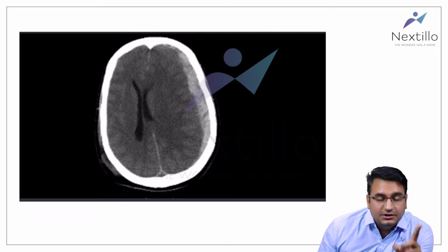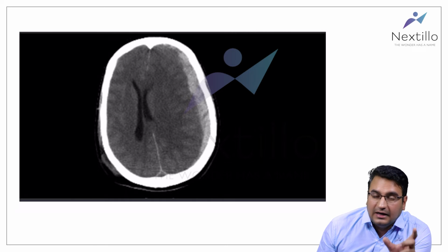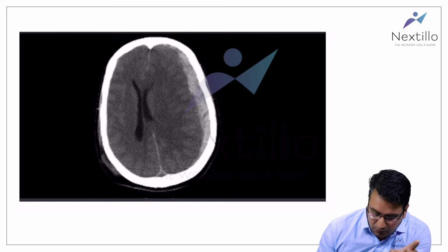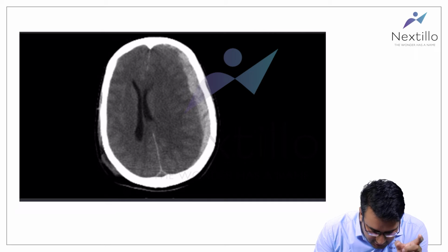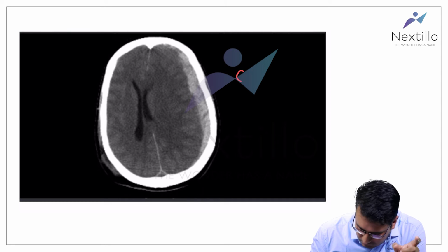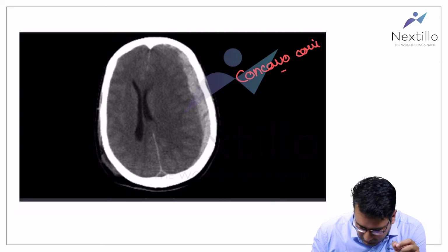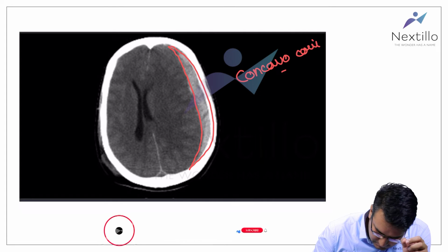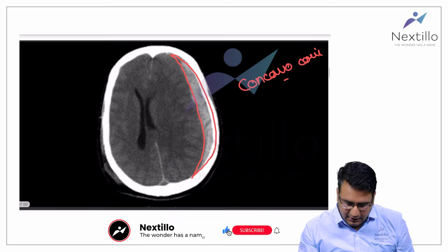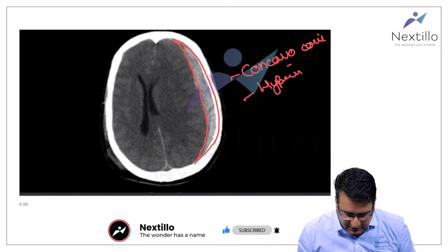First we have to look for the shape. In the extradural, we see a lentiform or biconvex shape. What we have here is concavo-convex. This whole part is hyperdense and concavo-convex in shape.